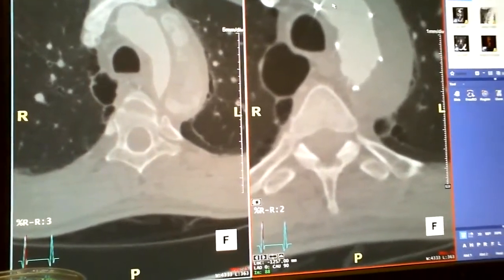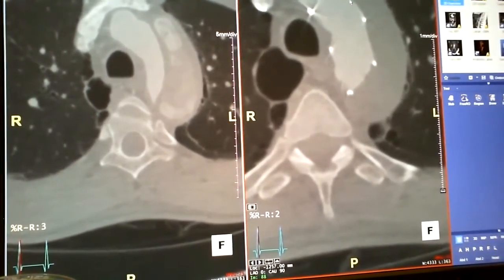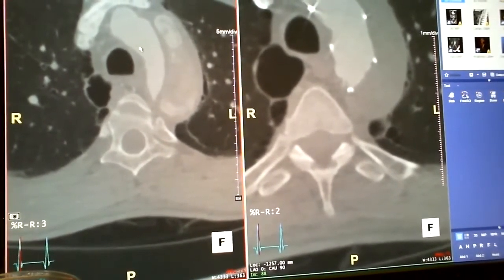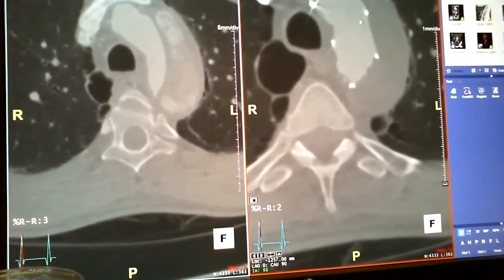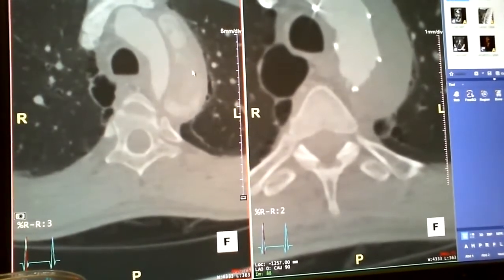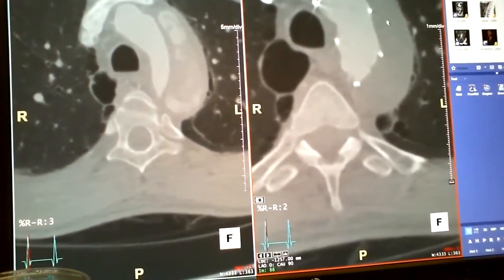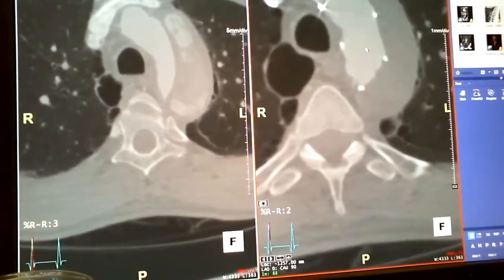So this is the blood vessel after it's been treated, and we can see that now the blood vessel is expanded. This is the true lumen. The true lumen over here comparatively was small before the treatment. Now it's fully expanded. The false lumen had blood flow in it before the treatment, before we covered the tear and the entry point for the dissection. Now, after we've covered that entry point, the false lumen has thrombosed and allowed the true lumen to expand.